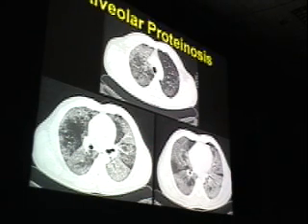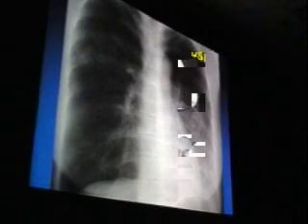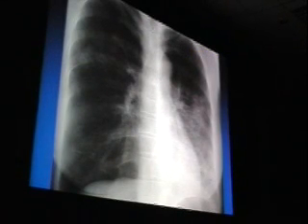Most likely diagnosis. Alveolar proteinosis, but what else would we consider? Alveolar cell carcinoma with this pattern. Lipoid pneumonia, although we have a fair amount of upper lobe involvement, that's usually from aspiration of lipid material in the lower lobes. If there was a clinical history of such an agent, of which there wasn't, then a biopsy. This was alveolar proteinosis, with very similar opacities, frankly.